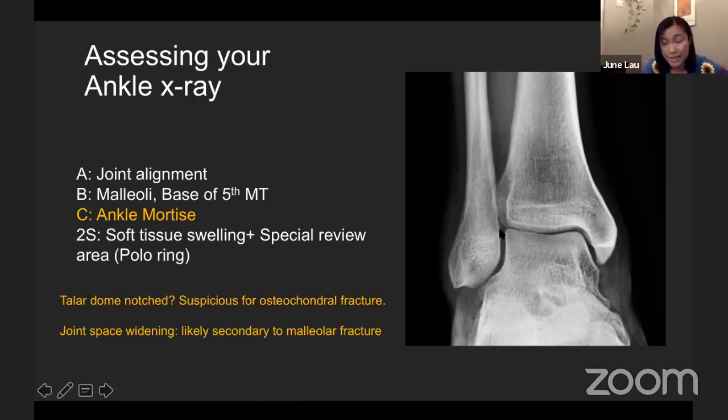You want to make sure it's nice and clean, so you can only see, well, sometimes some of the distal tibia through it. If you look at this line here, this is the anterior joint line. The width of the joint space is equal throughout, and if you can't see any flecks of bone in it, then hunky-dory, moving on.